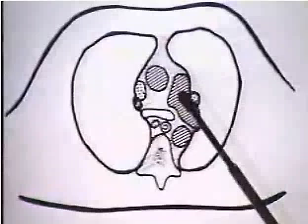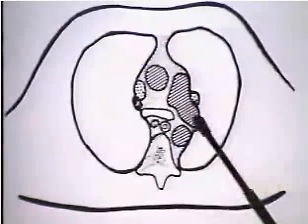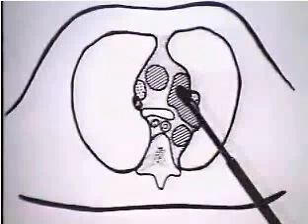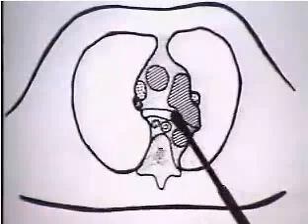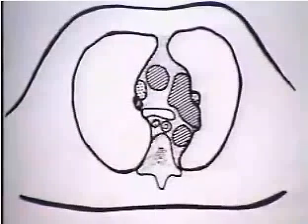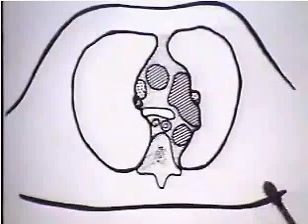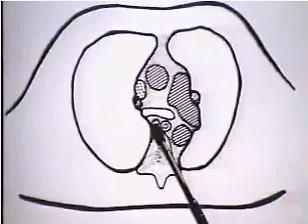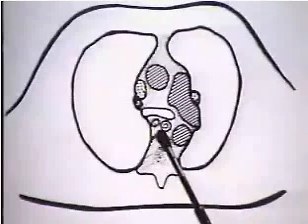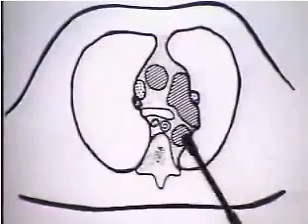Now we have a very irregular shadow here because we're looking at a portion of the left pulmonary artery and a portion of the main pulmonary artery. You can see that the trachea has reached the bifurcation and has started to spread out. You can see behind the trachea the azygous vein, which in this diagram is still on its way back to its position in front of the spine, and you can see the esophagus back here, ascending and descending aorta.